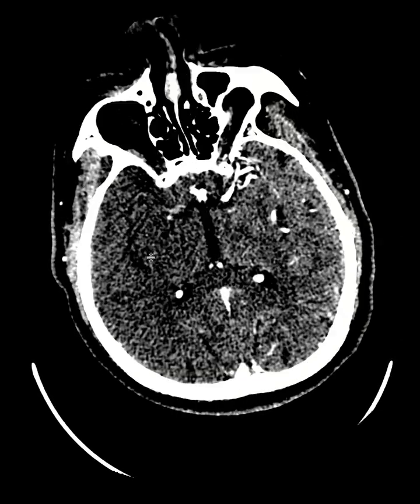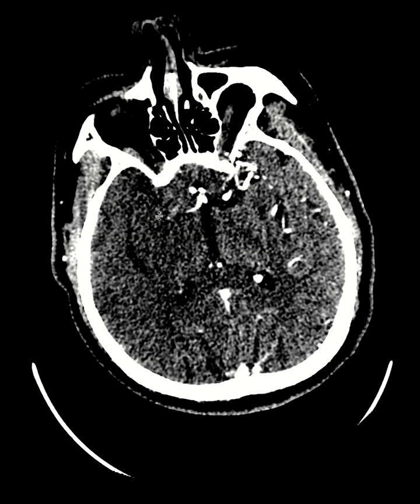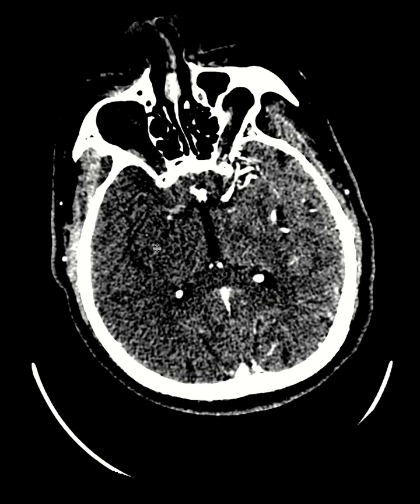Sometimes you see the hyperdense vessel sign, which is not very well seen here. It means that when you have a clot in one of your big vessels, you're going to see hyperdensity on that. That's one of the clues that people used to use when they didn't have the luxury of the fancy equipment that we have nowadays. So that was used to find a clot in non-contrast head CT previously, with the hyperdense vessel sign.